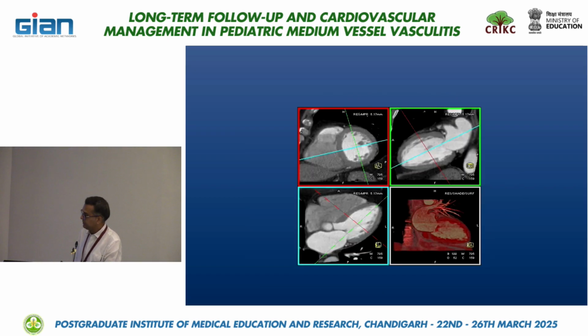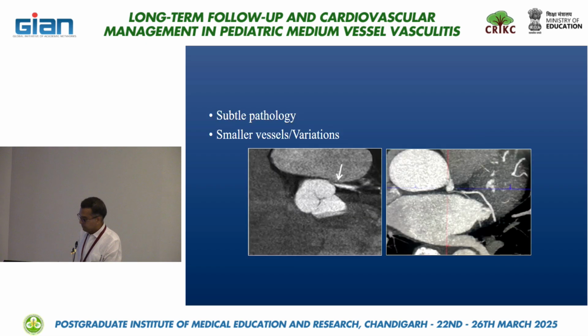So on CT, this is very easy to make, and we can see the same morphology, same picture on the short axis images and 2 or 4 chamber images. We can see the coronary course mirrored to echocardiographic practice, as well as on the volume rendered images. Moreover, we should look for ostial pathology or some branch abnormalities, because these vessels are very small and they should not be missed. So it demands a very high quality acquisition of the CT.